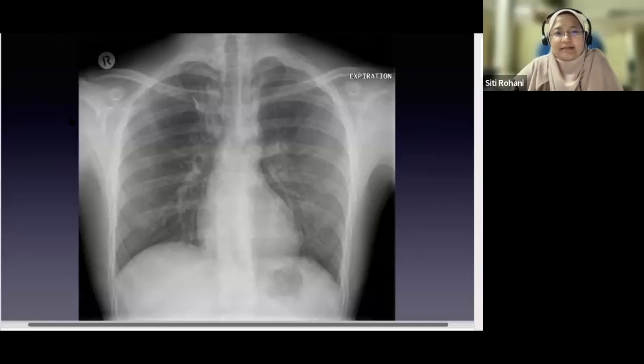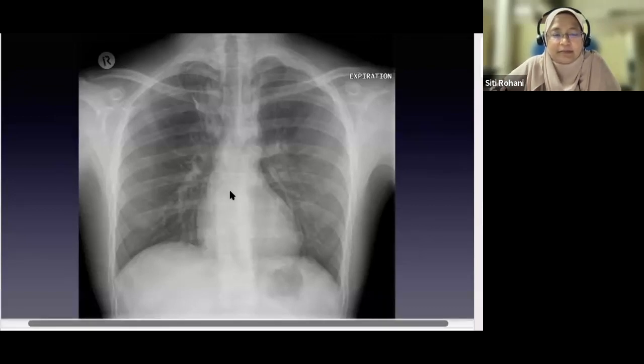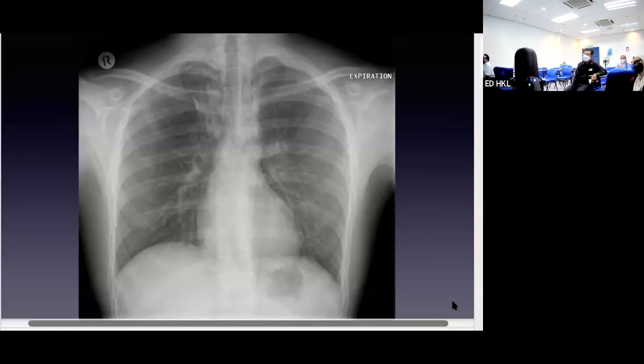Asma. Ini patient asma. So all these changes, pneumothorax, pneumomediastinum, are caused by asthma. Patient coughs, asthma, SOB, cough, like straining. Patient is constricted, maybe the patient tries to breathe very hard, and somehow the air tends to leak, and leaks into the mediastinum. A little bit of pneumothorax that we can't see. If we do a CT scan we would see it.